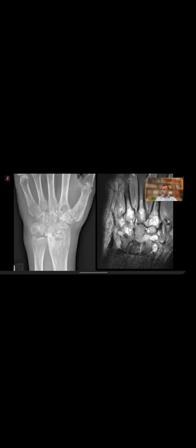But remember this: when there is involvement of the wrist joint and you see erosion of the metacarpal bases, this is most likely gout. Okay, so this is, as mentioned, my initial case I showed you. This was a clue here. Of course, there are many erosions there, another erosion in the distal radius, and erosion of the triquetral bone, marked osteopenia. It can be septic arthritis, it can be inflammatory, but this is a clue: big erosion of the metacarpal.